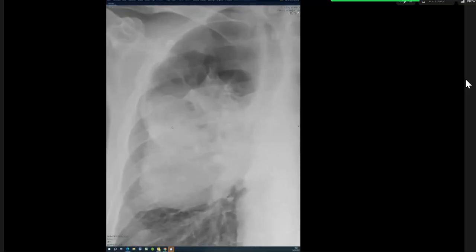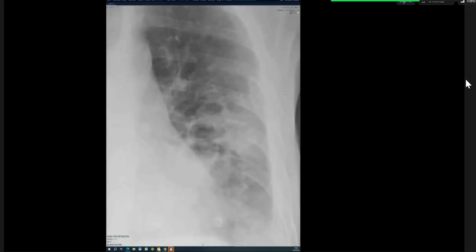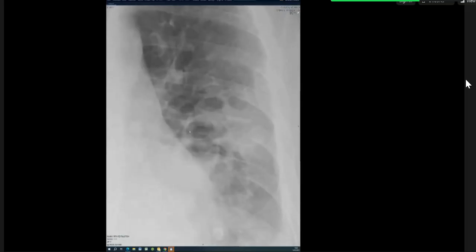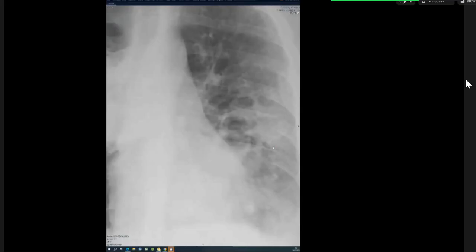This may be multi-component. What is this? This can be maybe a cystic lesion but not typical with a fluid level. But the shape, about this one, maybe here multiple cavitations or multiple cystic changes in the region.